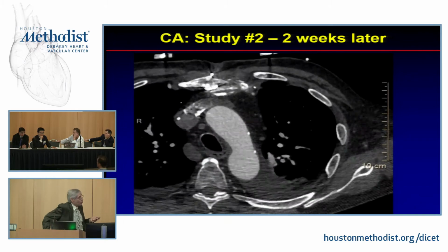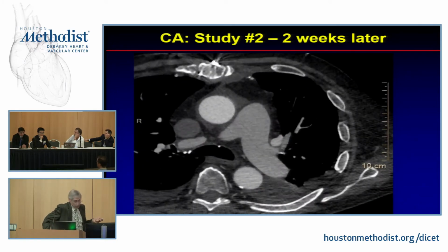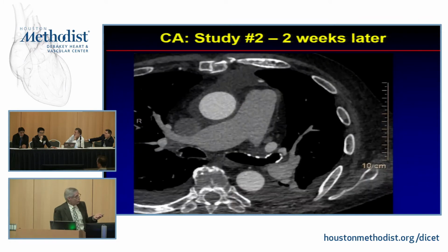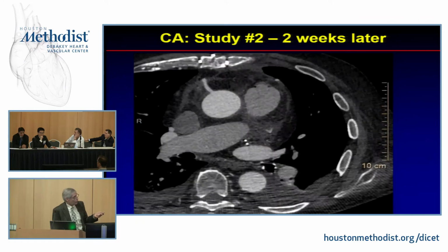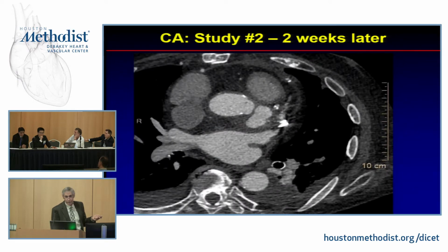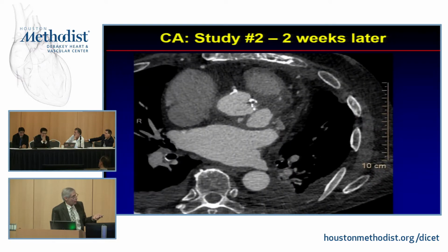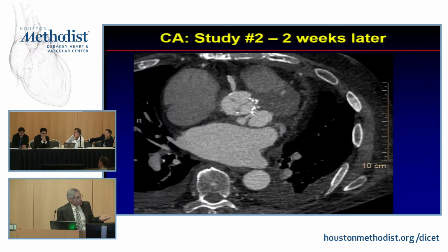All right, so there's the aorta again. Ascending, descending, pulmonary artery. And I think you'll notice something. Well, the pulmonary artery is enlarged there, but notice that's exactly where we saw those increase in Hounsfield. This is 2 weeks later. And what is this now? This is now a pseudoaneurysm and an abscess, probable abscess cavity. And it's right underneath that left main.